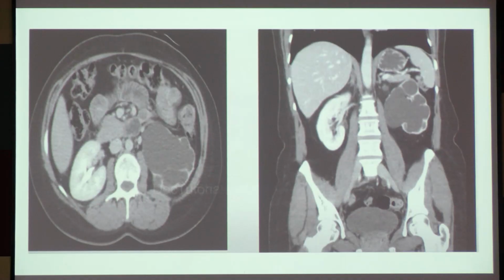In normal water, it will get opacified, but it will not drop down. But in pyonephrosis, it will not become hyperdense. So that may be a pyonephrosis. To comment that, we require an excretory phase. Okay? So this is just saying that there is something problematic here, something which has accumulated inside the kidney, compressed onto the whole cortex, and the whole cortex has become a thin rim.